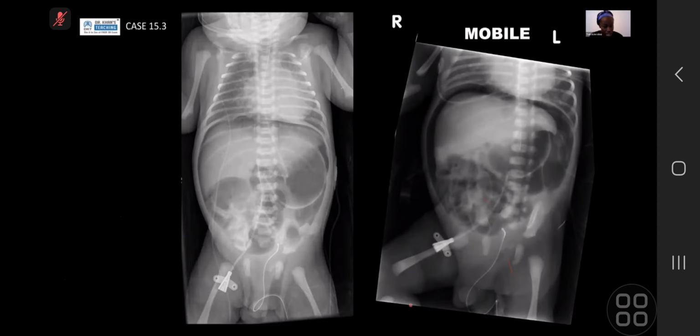And then finally on this case, this shows a continuous diaphragm sign. If we look very closely at the diaphragm, you can see the entirety of the diaphragm, even across the midline, which we don't normally see. That's because you've got air on both sides of the diaphragm, so you can see it in its full extent. So this is pneumoperitoneum.